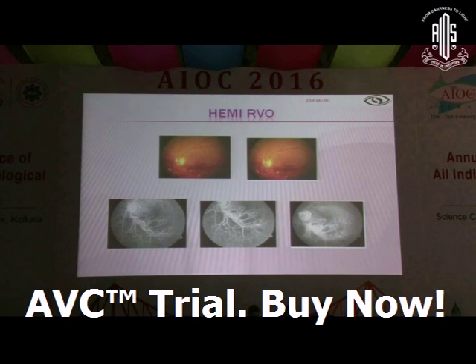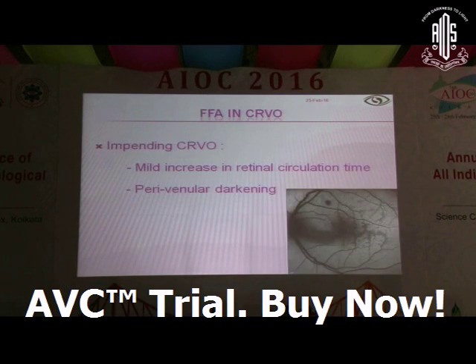The next extension of a retinal vein occlusion is a hemispheric retinal vein occlusion where more than two branch retinal vein occlusions in the same quadrants are involved. And here again the angiographic picture we expect is in the form of a blocked fluorescence, and sometimes you might see a capillary non-perfusion area, and these are the patients who are more likely to develop neovascularization. Now moving to the central retinal vein occlusion.